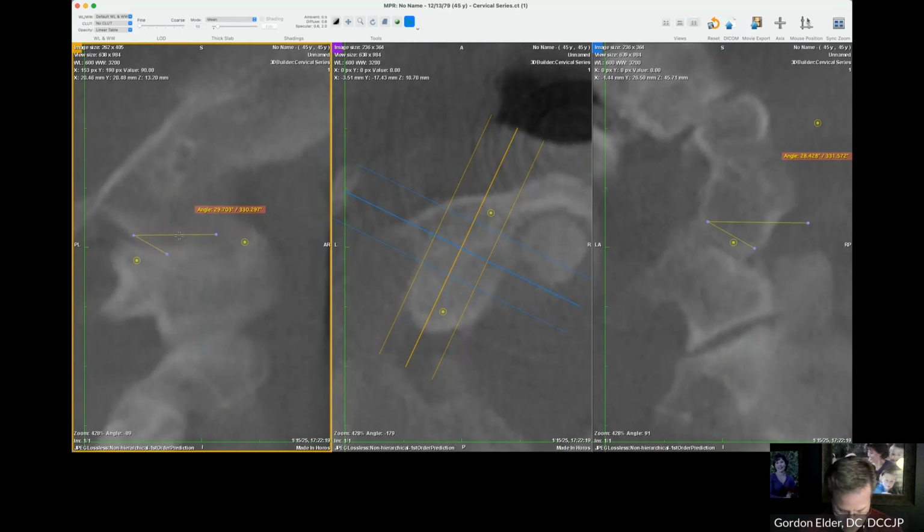All right, again, I'm measuring the skull side. I'm going to make sure that my line is level with my reference line. Here we have it. We've got a convexity on the left side. We've already seen the convergence angle. We've got the convexity of 28.8 or 28.9 or 29. I like to go to the 10th. It's probably not necessary. Just round to the nearest degree. Degrees are so small. Here's a 28.4 or 28 degrees. I would write that down.